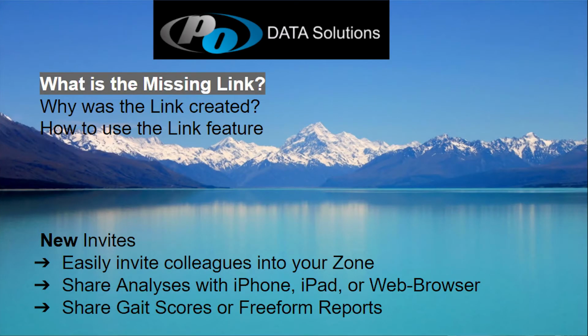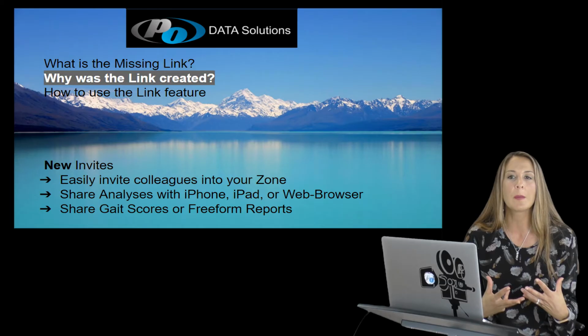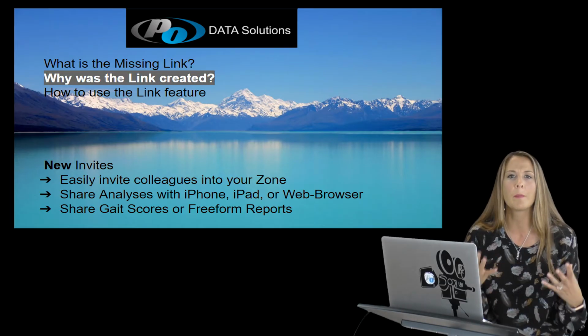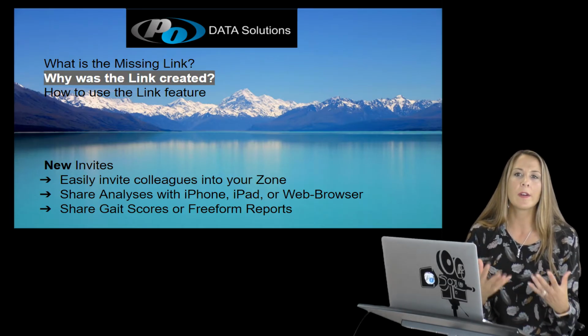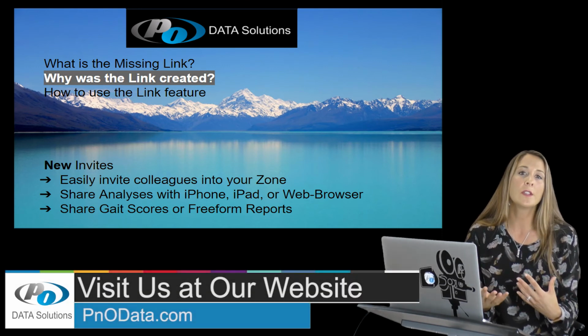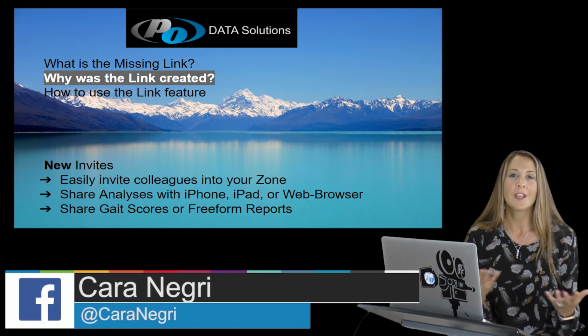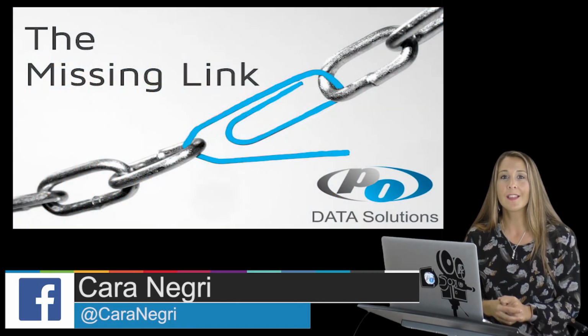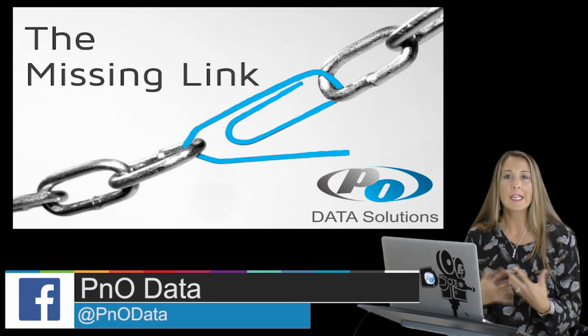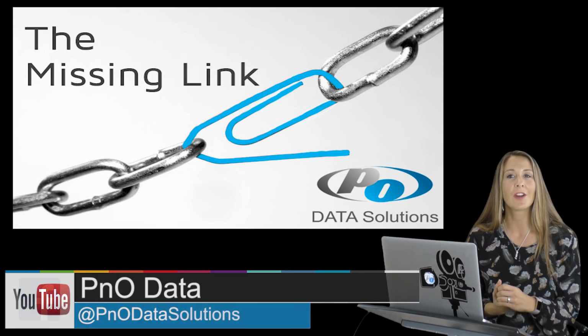So we've gone over the missing link. Why was it created? You asked for it. You wanted a way to safely and securely share videos with people without having to email long, big files, and your analysis and your observations with the drawing tools in an email or another way to attach to your electronic medical record. So that is the link, and the feature is already available for those who have a PnO Data zone. You can go ahead and start using it right away.